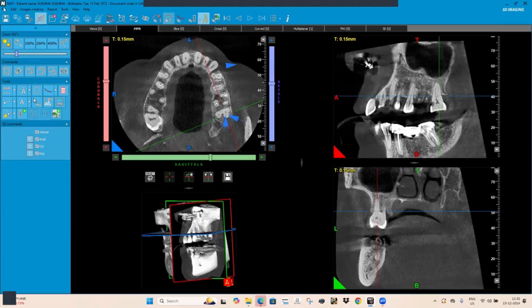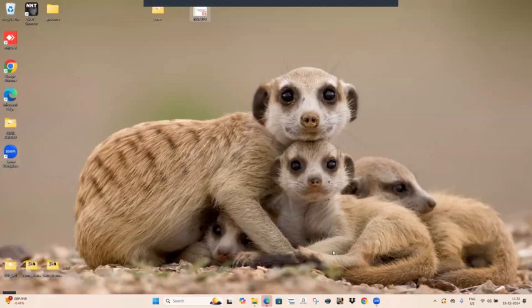Okay, I have one more section, that is the quadrant one. So I'll show you that one. So I think the things will be much clearer. Wait, I'll open it. Give me a second.